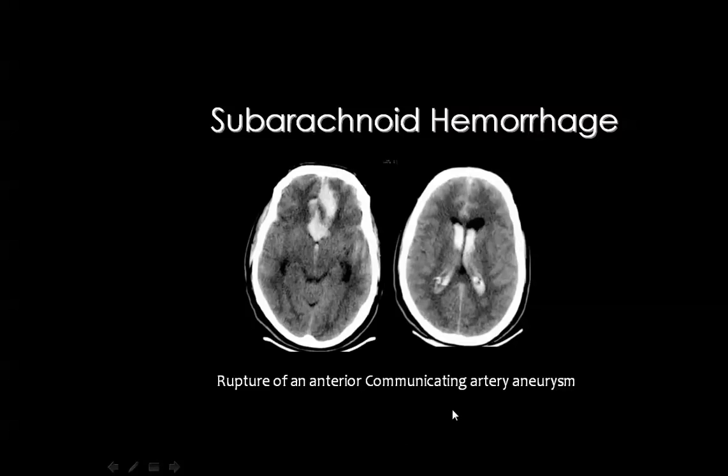One of the common causes of subarachnoid hemorrhage is the rupture of an intracranial aneurysm, besides, of course, traumatic insults as well. Then you can identify the site of the bleeding aneurysm. I will discuss this in full detail in the lecture on intracranial vascular malformations. You see the site of the ruptured aneurysm by an area of hemorrhage surrounding the site, and this is the commonest site for an anterior communicating artery aneurysm. Then here you can see the hematoma, and also you can see hemorrhage inside the ventricles.